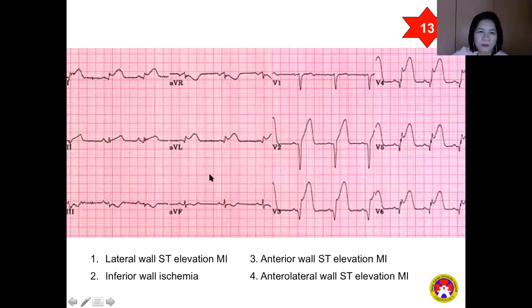Now about this one. Here we see PQRST with the same morphology at the rate of, if we see here, 300, 150, 100, 75. So this is around 70. So this is normal sinus rhythm. But what you notice is you have an ST elevation in lead 1.